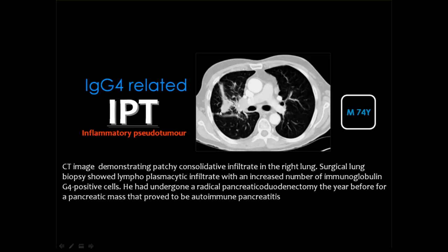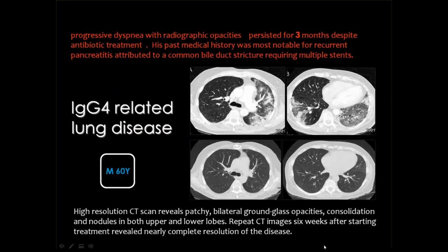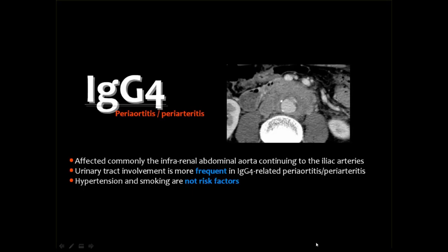And this is also another example which looks like an aggressive lesion. And you remember that these lesions are metabolically active. Then, if you have the PET scan, you may highly suspect the bronchogenic carcinoma, and consequently, the patient will have biopsy to confirm the diagnosis. And this is also another example. You see the ground glass infiltrations, which are bilateral, and there is good response to corticosteroids, which is exactly similar to what has been mentioned before about Churg-Strauss disease.